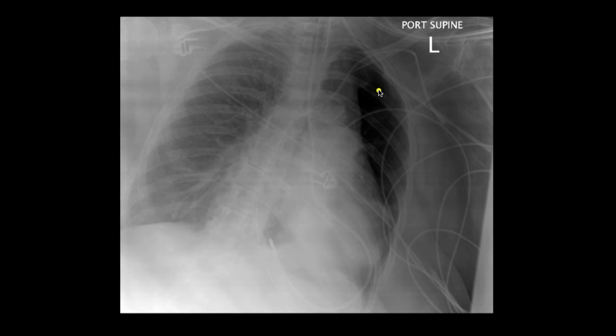You can also see that there are differing radiodensities in the lungs. You can see the hazy density on the right, and you can see very lucent areas of lung. So almost certainly this patient has an associated pneumothorax, where air has ruptured out from the bronchus and is lying within the pleural cavity.